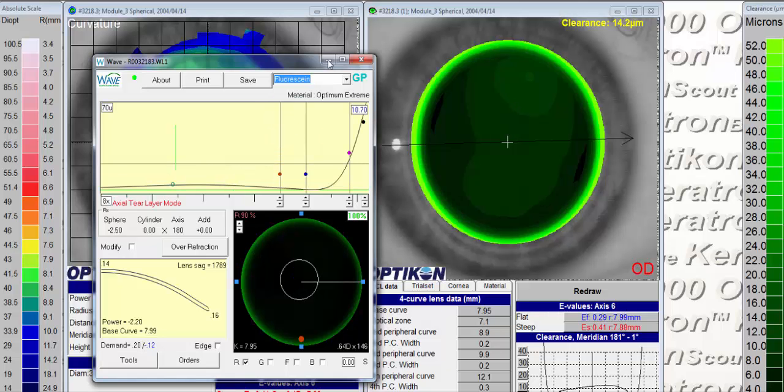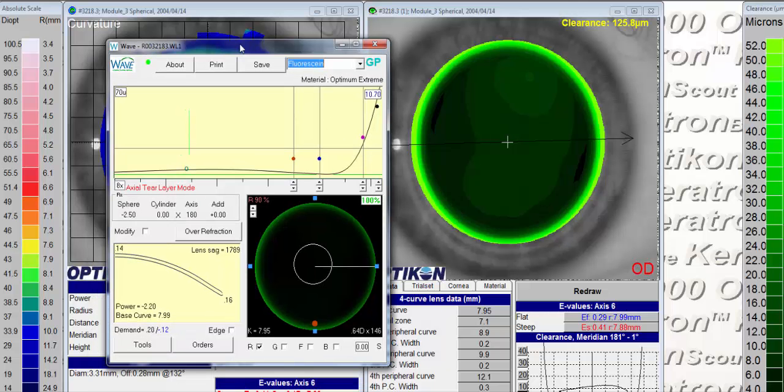It's the typical approach to trying to make the patient so that they're unaware of the lens. Now, I'd like to say that I don't really think this is great for Ortho-K. Typically with Ortho-K, you need a pretty low edge lift. It just works a lot better. But for conventional design, this might be what you should do in your wave design to address edge awareness. I think when we're this far away from the cornea, the detail of the edge becomes less significant.